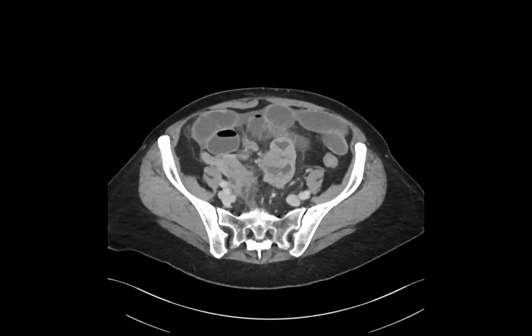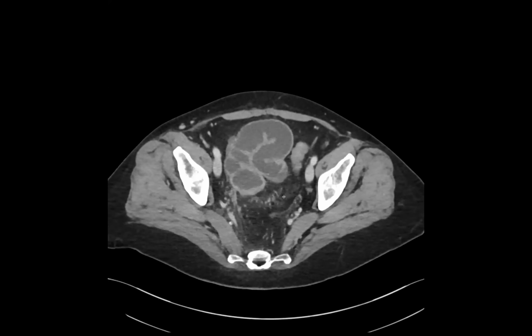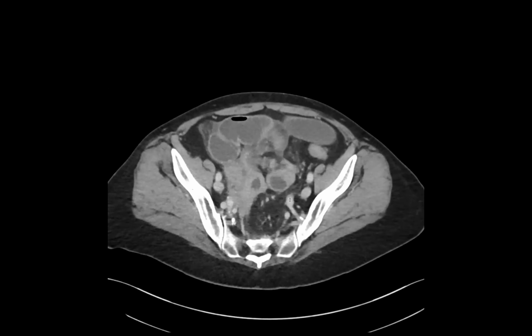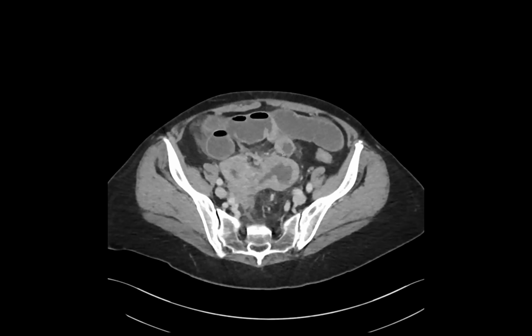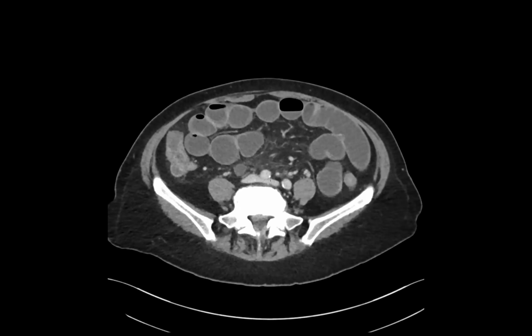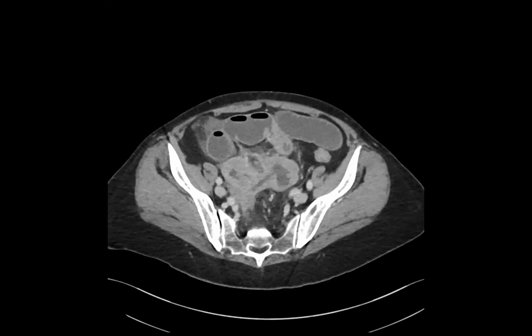Yes, this was small bowel lymphoma. This is pathology proven, and then got treated, and then went into remission. So just another face of small bowel lymphoma, right? I think we're taught that it causes ectasia, or just distension of the bowel. They're not supposed to be obstructive. This patient had obstruction, but that's one of the considerations, and it was called prospectively in the differential, adenocarcinoma versus lymphoma. Very cool. Nice.